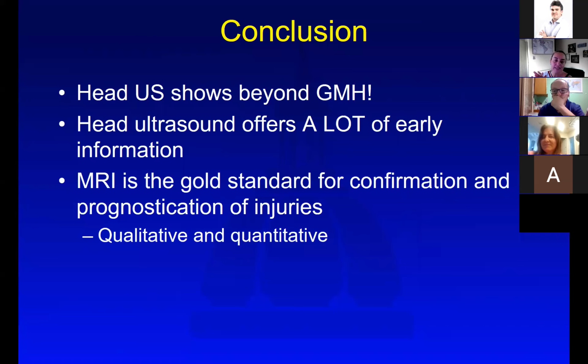So we look at the intracranial compartment, focus into that area, and look at the calvarium the best we can with black bone. Black bone shows fractures better if the calvarium is thicker. So in older ages, I think it's doing a really good job. The downside is it's approximately 6 minutes. So whichever child is having that sequence should not move for that period of time, which is a little shaky for the neonate.